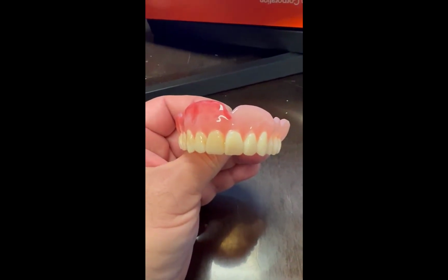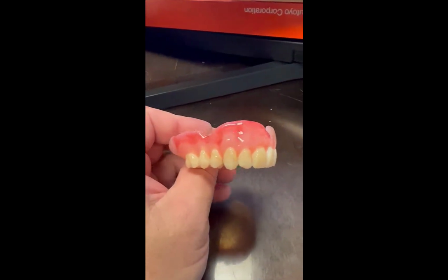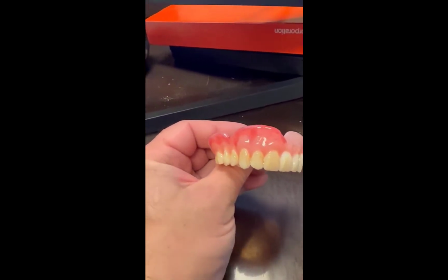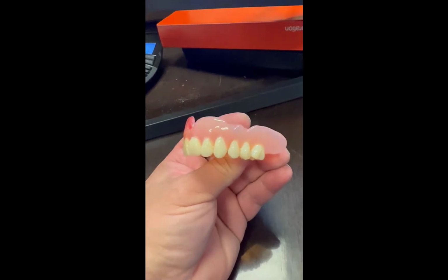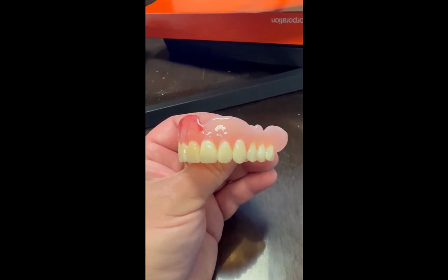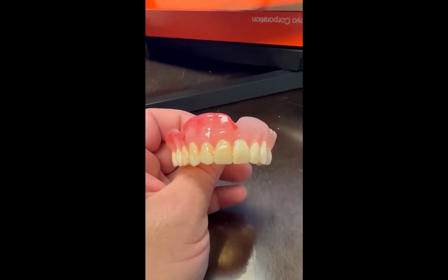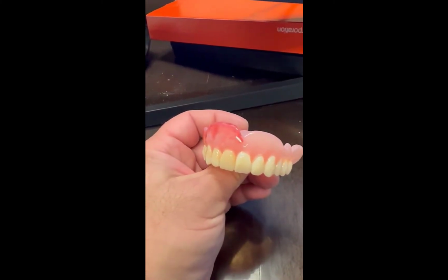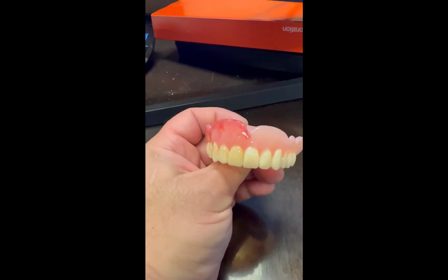Okay, so here is the completed denture. On the right half, I went ahead and added some Annex Gum, some Gradia, some Optiglaze, just to give it some characterization and show you how you can warm things up. And on the left side, I just did a coat of Optiglaze, and that's going to help keep the teeth from staining. Anyway, it'll keep them a little bit more resistant. I spent about 15 minutes total on the right side, and I just wanted to show you that you can characterize this material very easily. And there it is.